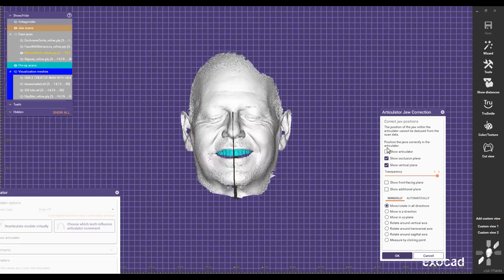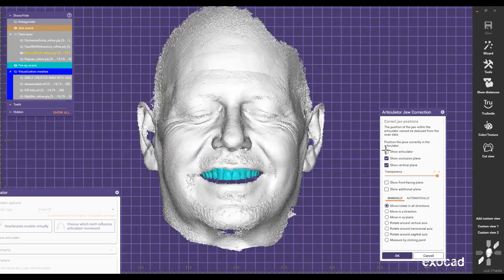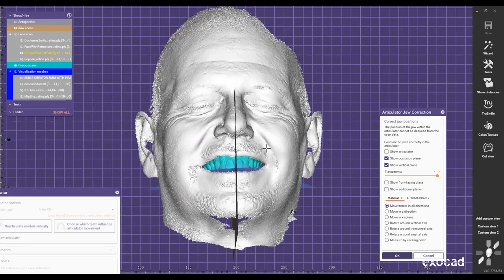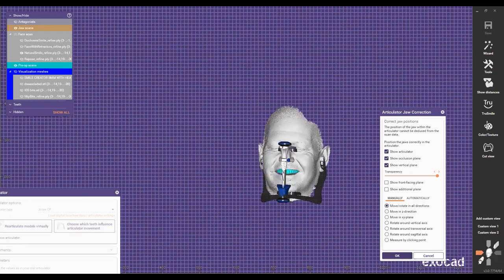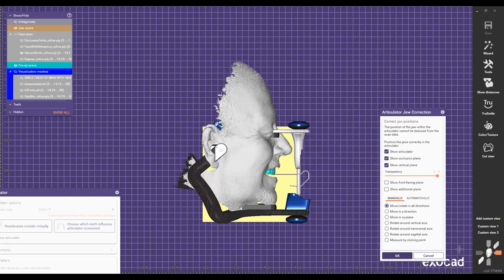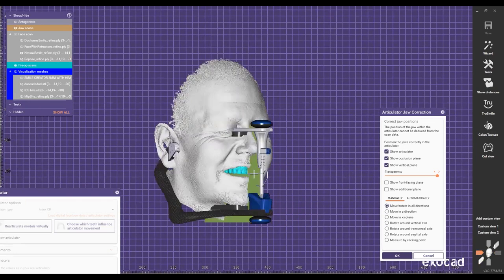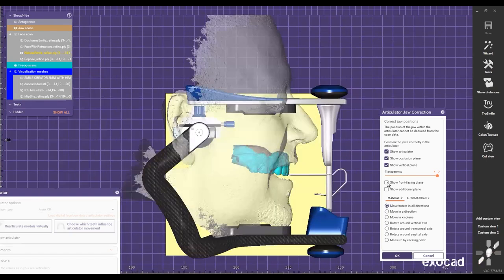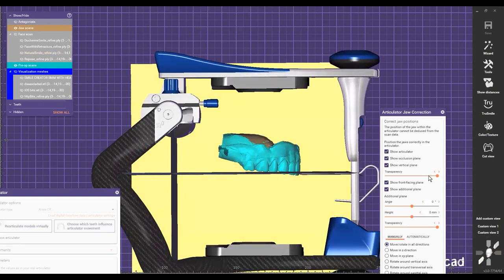Once the facial scan is there, now we just leave it there. Everything is touching the pin, everything is there, the condyles, everything. So now I'm able to have a more accurate position of the face. And because the intraoral scans follow the face, now I have proper position of my jaws, the proper plane right here, right? And I can start looking for these planes right here and start changing the angle here, right?